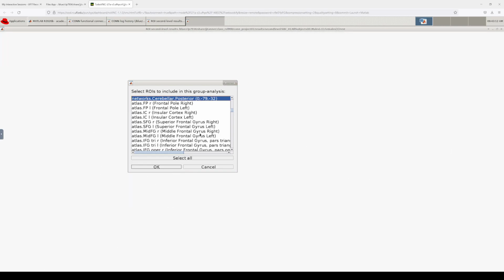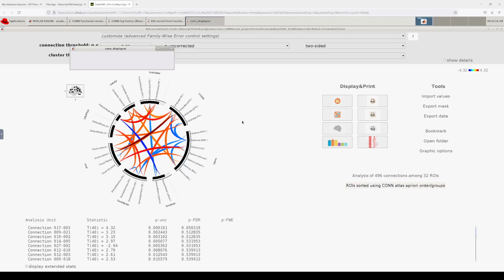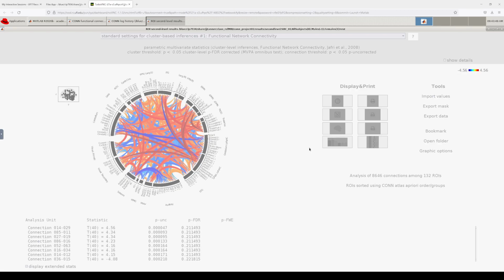And then let me just show you, let's look at the structural regions of interest. Let's see if we see anything. Again, for research, generally you're going to have some hypothesis. There's a lot of regions of the brain, and I'm not correcting for multiple comparisons. So let's go back to that. And there's different ways to do it. Again, you have to understand the statistics behind these corrections for multiple comparisons.